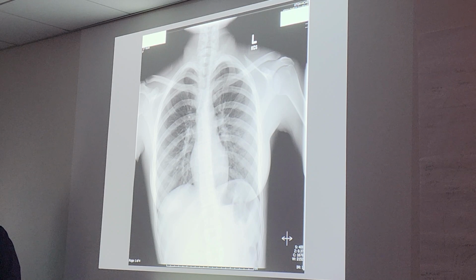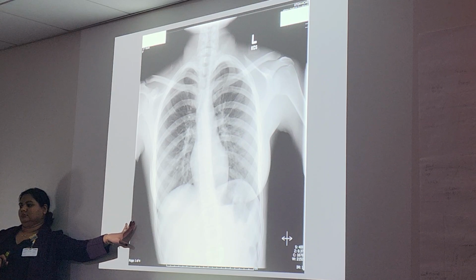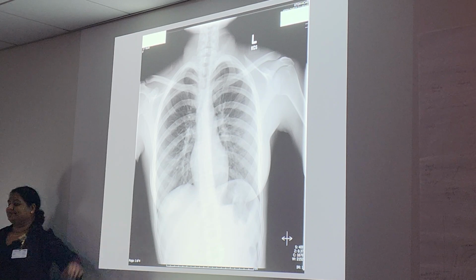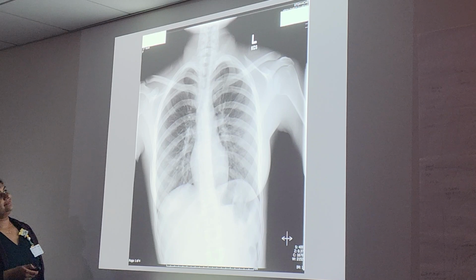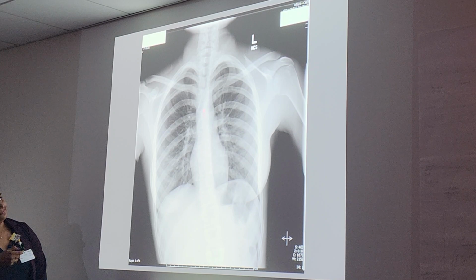Is it rotation on the left side or on the right side when you see that? What side's elongated? The right side looks elongated? The clavicle looks very short. I think the left side. The left side looks elongated to me. What do y'all think, Anthony? I think the right. If you look at the spinous processes, you're seeing that they're pointing slightly to the right, so that's going to show you which way the patient is turning. So that'll kind of give you an indication of it.